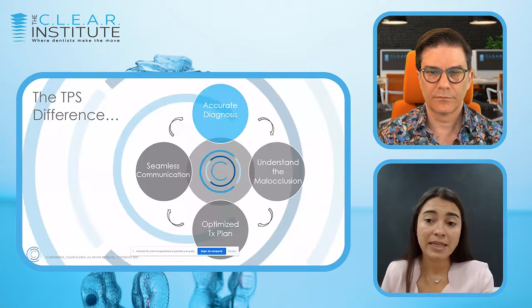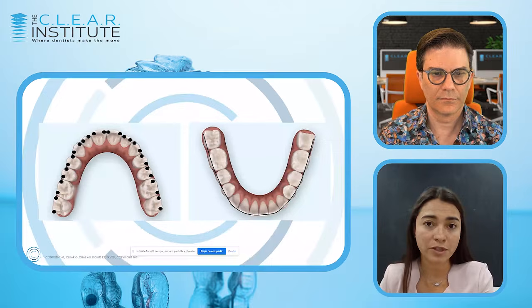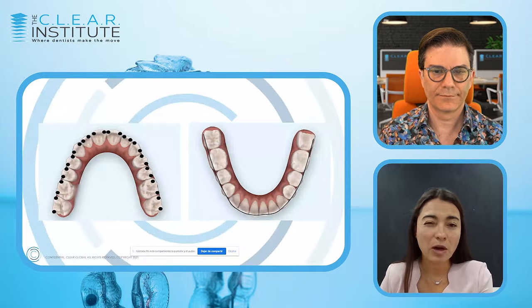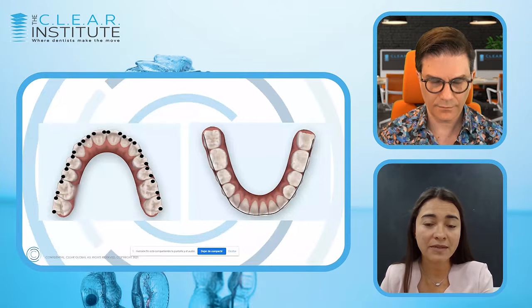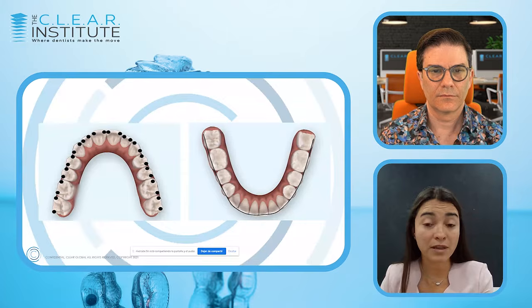What we can see here on the screen is what all clear aligner software does, and I think we commented on this last time. I really like this image because we need to understand as clinicians that software is great.